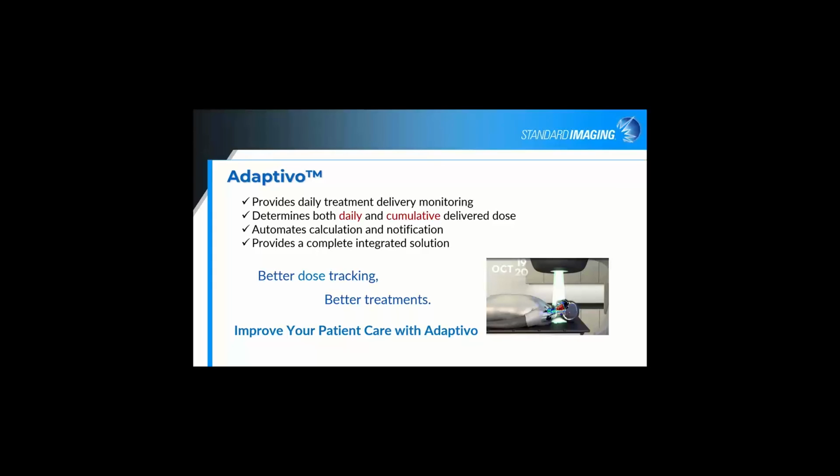So I thought this case well illustrated how to improve your patient care with Adaptivo by providing daily treatment and delivery monitoring. You can determine both daily and cumulative delivered dose, and of course, automated calculation and notification is provided.